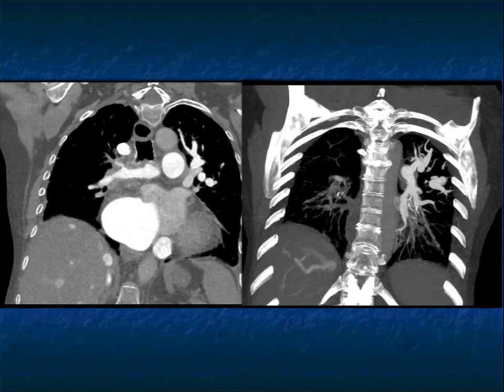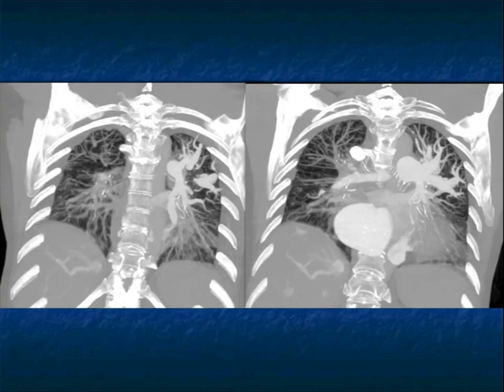And the soft tissue infiltration is kind of worrisome. Could this patient have radiation therapy and some fibrosis after? Could this be a treated lung cancer? None of those things were true. And again, here it is when you look at the MIP imaging. Again, the paucity of vessels in the patient's right lung, particularly the right upper lung.